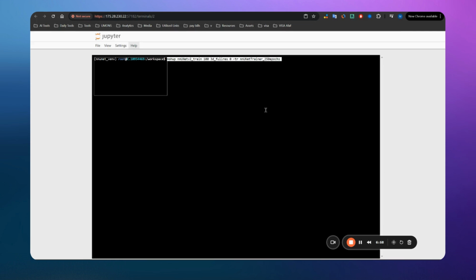We just need to run it, and then at the end of the training I will just show you what has been done. And after this step you will just have your model where you can evaluate it, you can do anything you want. But I will show you just one example after the training completes, how you can use the trained model for the prediction and for the evaluation. Okay, so let's run the training and let's come back whenever the training is done.